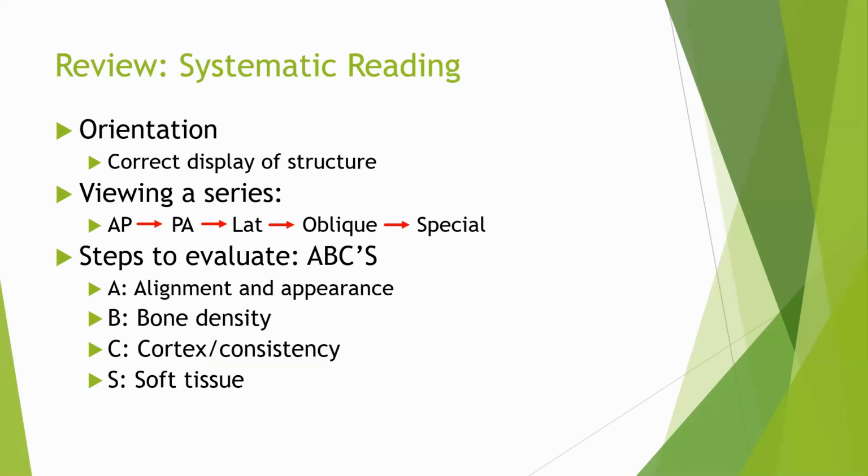In the soft tissues, again, if there is any kind of tear or anomaly, abnormality, contusion present, then you can certainly at least get an idea that something is not right. It will not give you the entire picture, but at least put a question mark in your mind to say, I think we need to check, evaluate with hands-on palpation, or better, do an MRI and check if there is any muscular or soft tissue tear or pathology going on or not. So that's essentially ABCs. That's how one should go over X-ray reading.